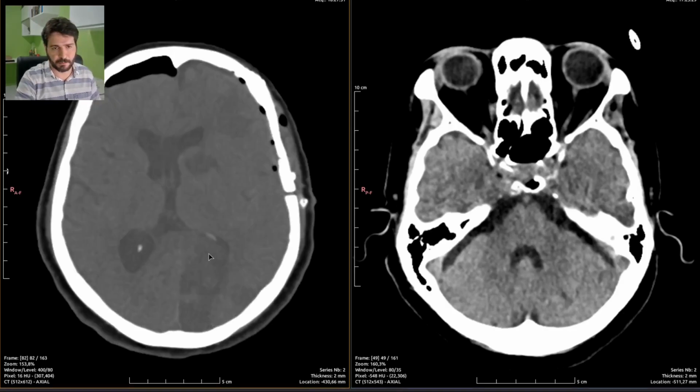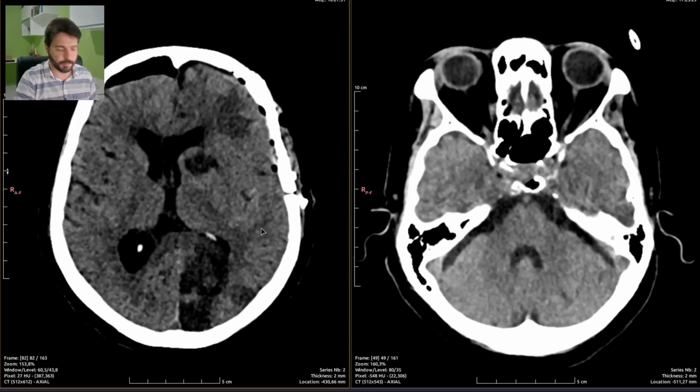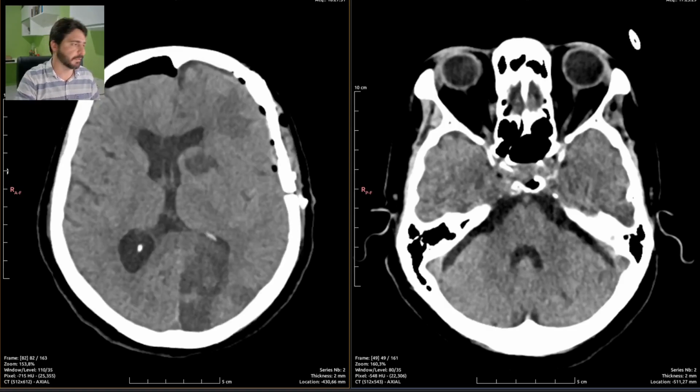This is a very, very severe post-op case. So head CT scans aren't really always that easy to report, as you guys have noticed. So I'm just going to be a bit silent so I can focus on the report. Don't mind me, you can actually skip ahead to the next exam, and I'll see you in a bit.